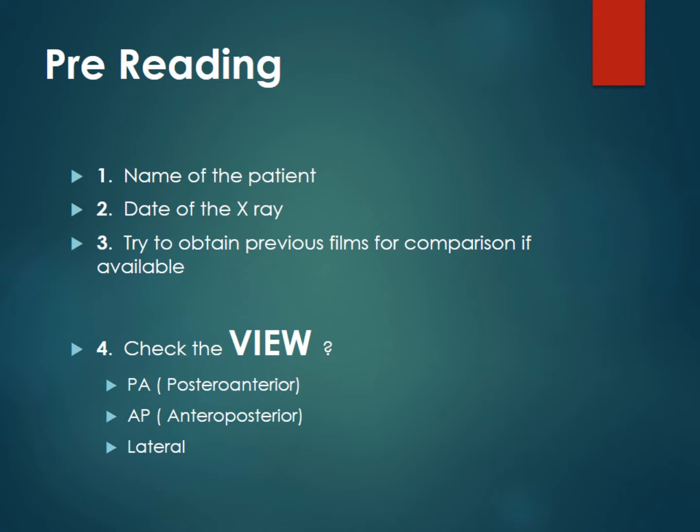Secondly, the date of the X-ray. This is very important because whether the patient has brought the X-ray of the same date to which he has come for the treatment or the X-ray is of some prior date. And thirdly, try to obtain whatever previous films are there for the same patient for comparisons.